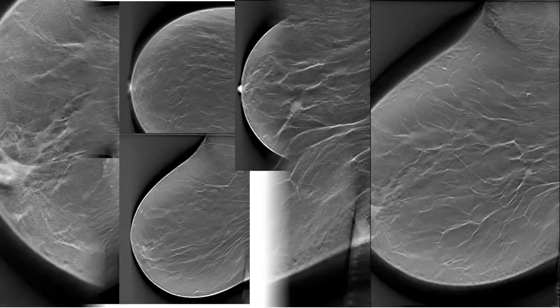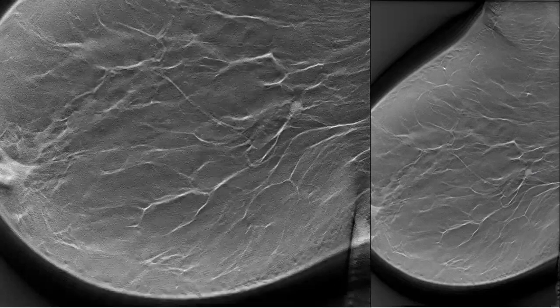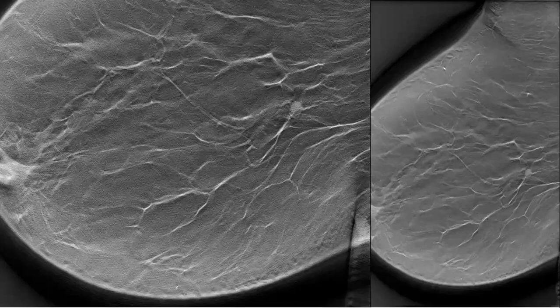Can you see it here? I make a zoom for that. Be cautious about labeling all of these nodules as intramammary lymph nodes without being very typical. We have to be sure that they are intramammary lymph nodes, and now with the use of tomosynthesis, we can see the borders and the fatty hilum of this intramammary lymph node.